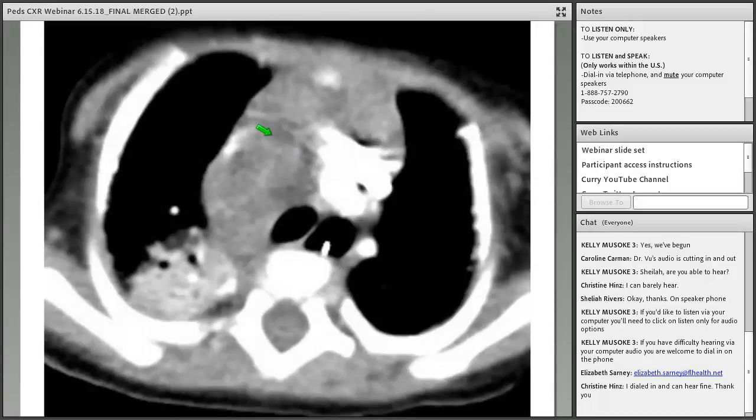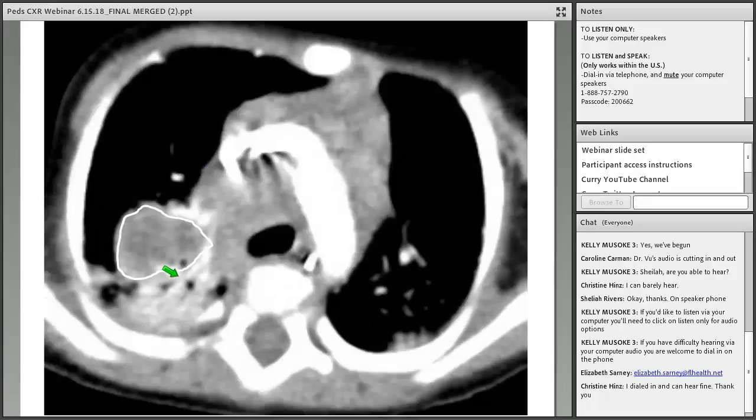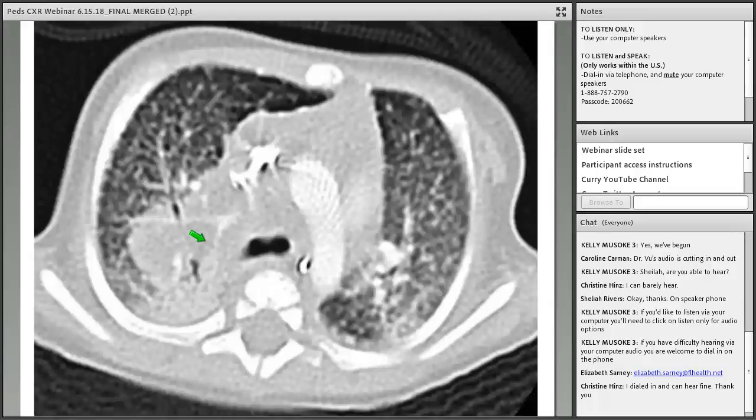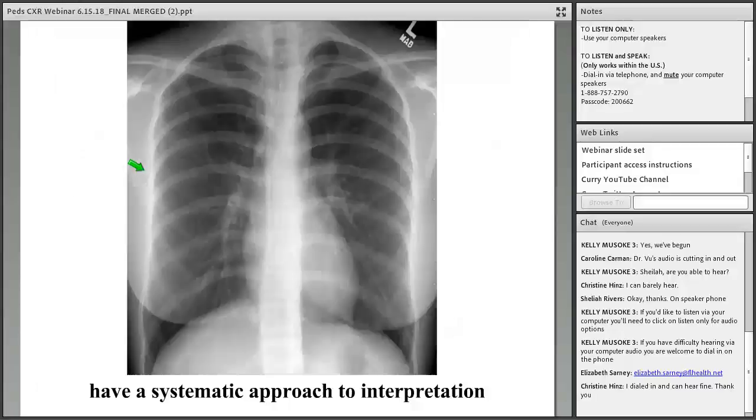This is a CT of the same patient. Here is the adenopathy seen on the lateral chest radiograph. Here's the atelectasis mimicking consolidation. And here's the actual consolidation itself. In the same patient in lung window, you can see that this patient has diffuse lung nodules, suggesting disseminated TB.